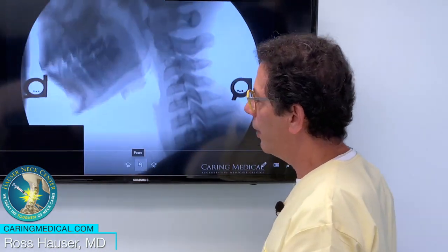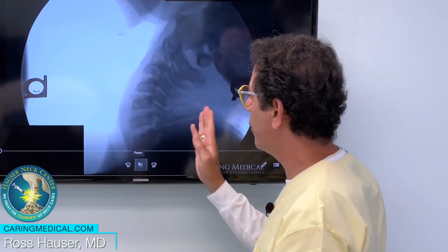little kids who can't walk quite right, like their coordination is really bad or their muscle tone is not so good. They probably have cervical instability, and the treatment that is needed is prolotherapy. We're going to watch this digital motion x-ray, and if we could stop it at about 15 seconds.